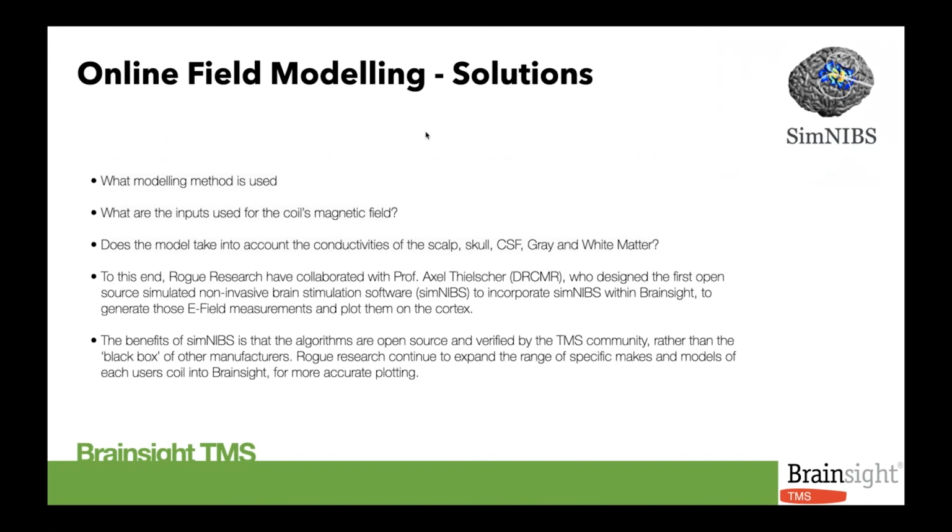So the research team chose to incorporate SimNIBS. Why SimNIBS? Well, because it's a peer-reviewed current flow modeling. So we know that it's open, or questions can be asked of it by researchers, and it's that kind of validated model that we're after.